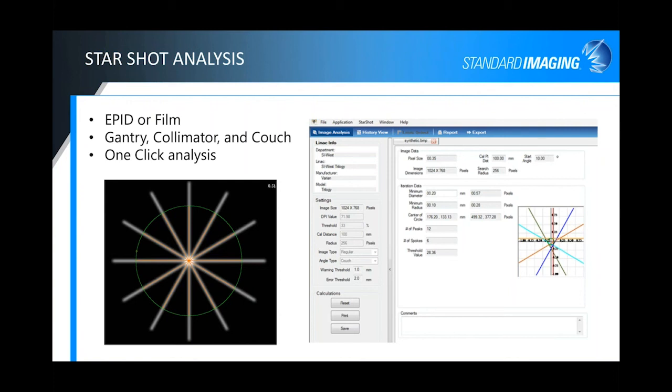All you need to do is click on the center of the image and calculate, and it will automatically give you those results. So the nice thing about PIPSpro is pretty much every test in the system now, once you bring in those images, it will automatically calculate on those images and on those tests and give you the results automatically.